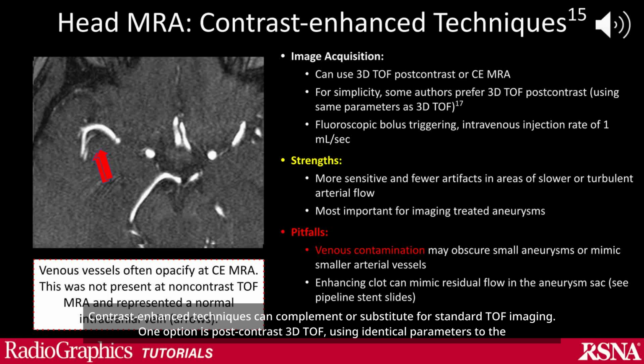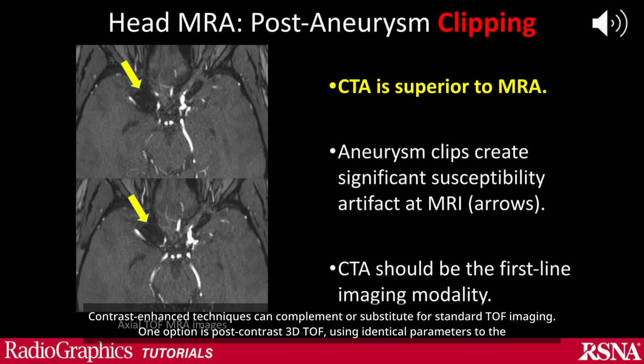Strengths of contrast-enhanced techniques include greater sensitivity in areas of slow or turbulent arterial flow, and particular value in imaging treated aneurysms. Pitfalls include venous contamination, which may obscure or mimic small aneurysms, and the possibility of enhancing thrombus being misinterpreted as residual flow within an aneurysm sac.